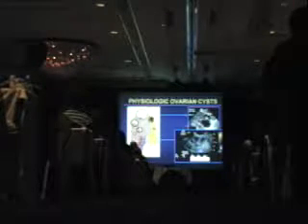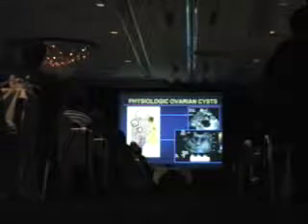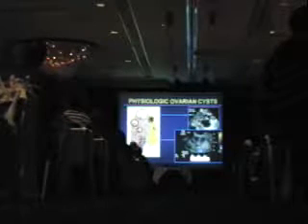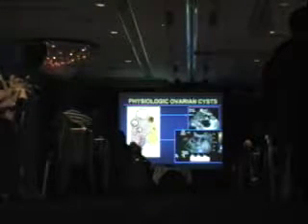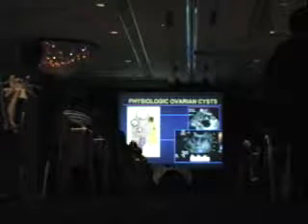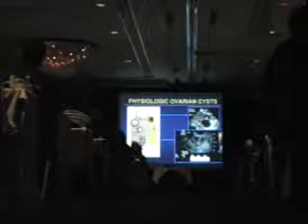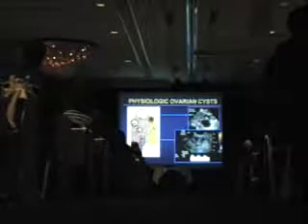And furthermore, if you put flow on it, it has a lot of low resistance. That means a lot of flow during diastole, just like a bad disease called cancer could have. However, there's no flow in the center. This is a young woman. It's the time of her cycle where I'd expect a corpus luteum. And if I saw that and I was shown this case, I'd say, most likely it's a corpus luteum. If I had to, I might want to rescan her in a couple of months right after menses to make sure it went away. In our hospital, we do not routinely do that unless the patients are back for some reason, because they're so visible on every woman if you scan them at the right time of the cycle.